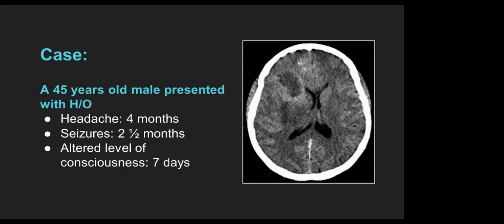Okay. This is a CT scan, axial cut, CT scan brain, axial cut. Till there you are right, but it's not a contrast. It is a CT scan brain plain. So why is it not contrast? Later on we will see in detail why it is not a contrast.